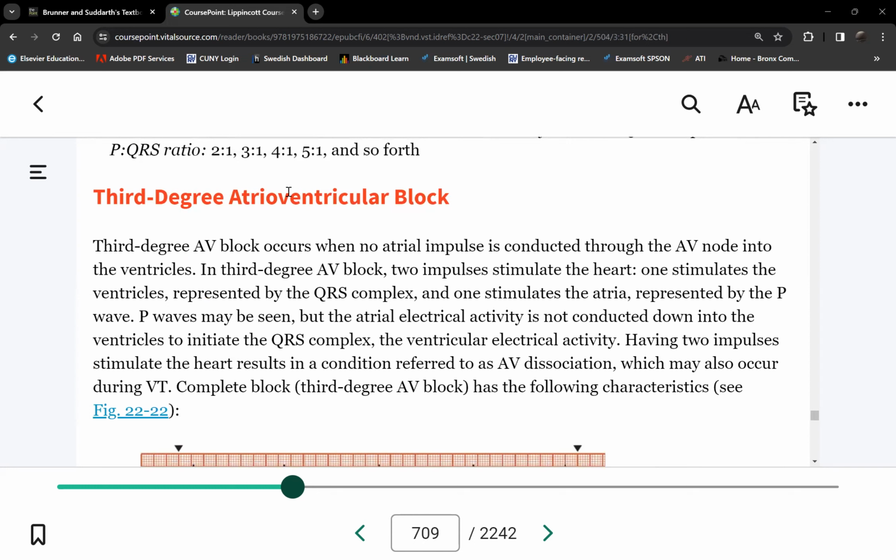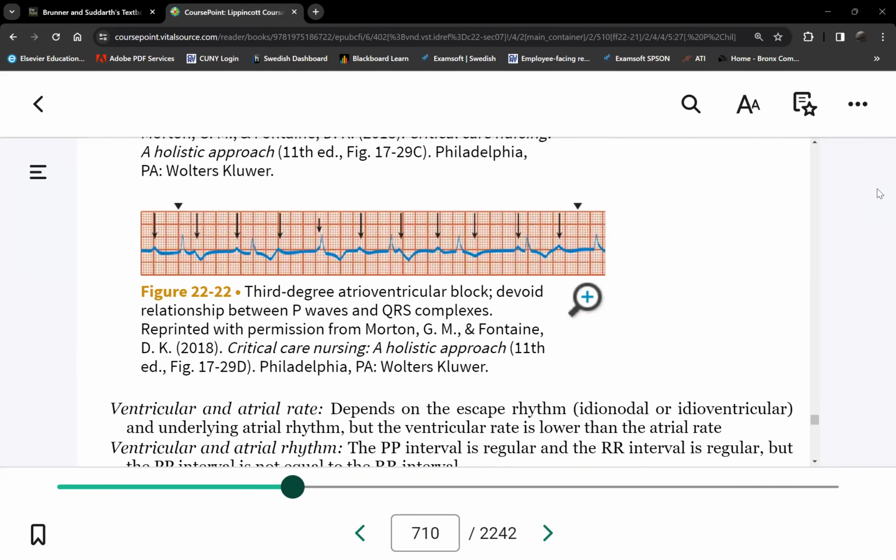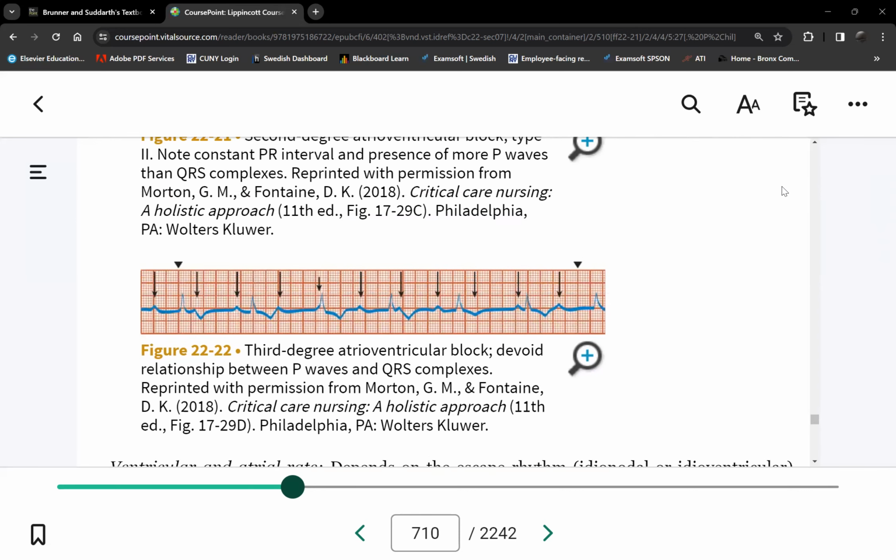And here's the worst type of heart block, which is the third degree heart block. There are two terms to call this. We either use third degree heart block, or it's also called complete AV disassociation. Okay, again, this is complete heart block or a complete AV disassociation syndrome. Look at the third degree heart block. So let's look at the rhythm using a Foreman's caliper again.